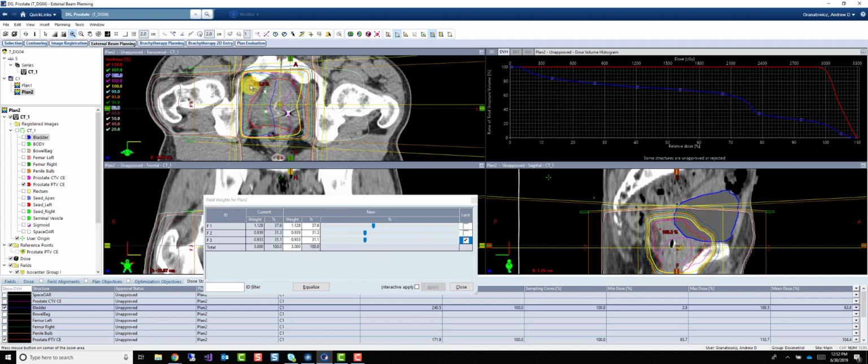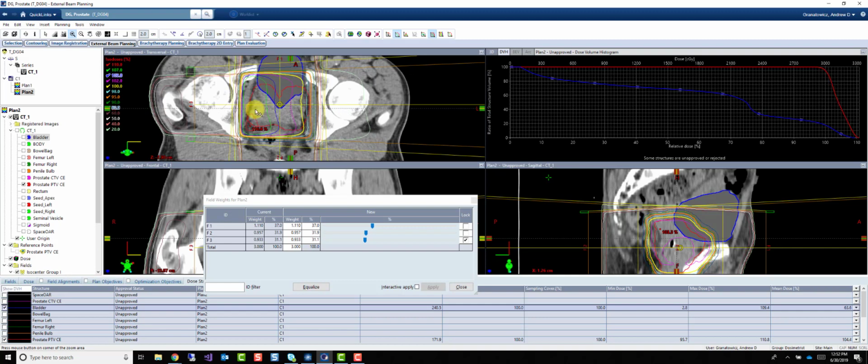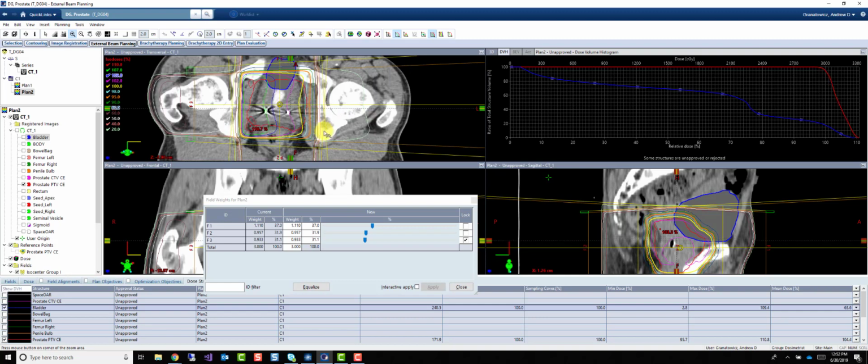So it's pretty close. We have now two spots right here, maybe just a tiny bit too much in the AP direction. So there we go, that's fairly symmetrical. Our size of our 110 right here is pretty similar. Close enough.